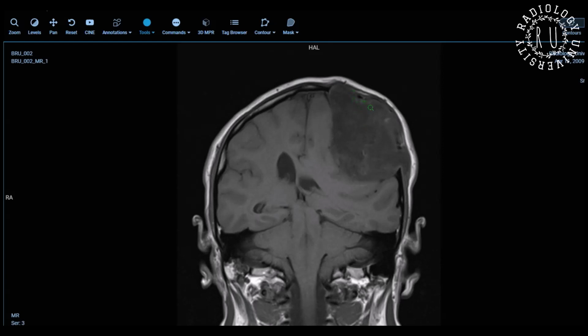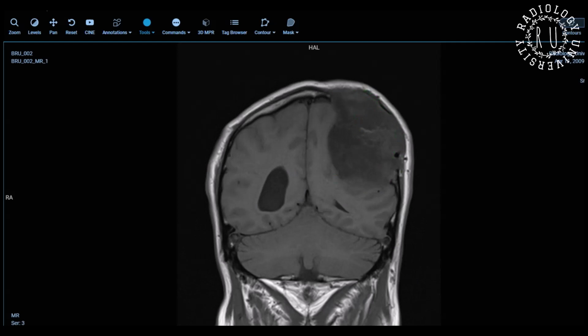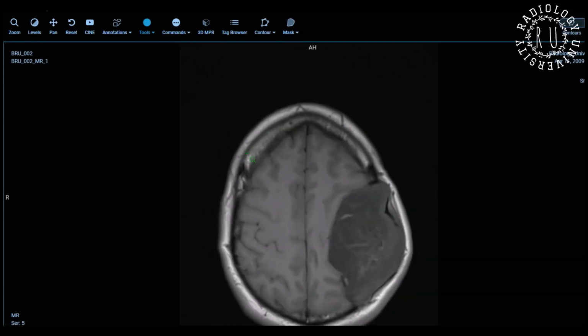That's a part of bone. If I would describe it, I will call it scalloping of the bone because it's not really going and destroying it. And this was done like long back, 10-20 years back. At that time they did not used to do diffusion. If I tell you that this lesion is showing intense diffusion restriction, would it change your differential? It could represent epidermoid. Yes. So it's a rare entity of intradiploic epidermoid cyst.